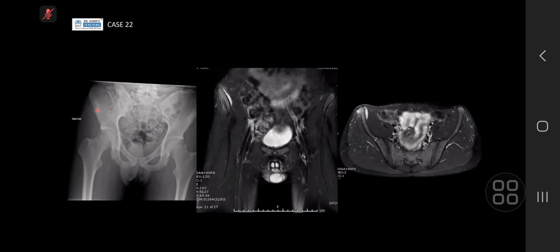And what you look for is the asymmetry between one side and the other side, making sure it's a properly centered radiograph. And this one it was, but I think the orthopedic surgeons just wanted further clarification on how it looks, and hence we got a nice image for teaching. On first impression, if you just saw this MRI in isolation without the X-ray, you can think, is this something a bit more worrying because of the marrow edema, because of the soft tissue swelling? Can it be something a bit more sinister like sarcoma?